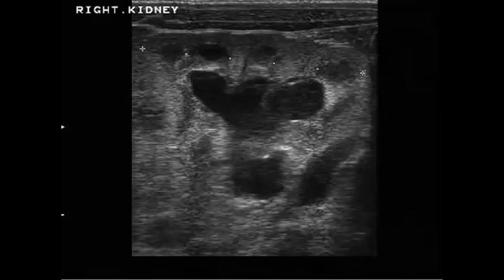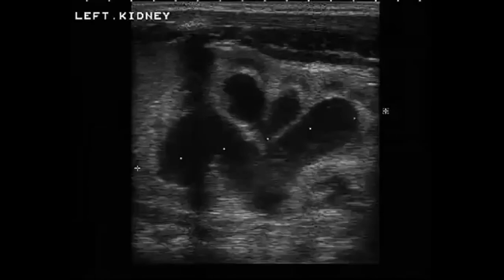Marwa, okay, thank you. Right kidney, what happened? Okay, hydronephrosis, Huda, thank you. Nice. And what about the left kidney? I will show you now. The same, yes. So you have bilateral hydronephrosis.